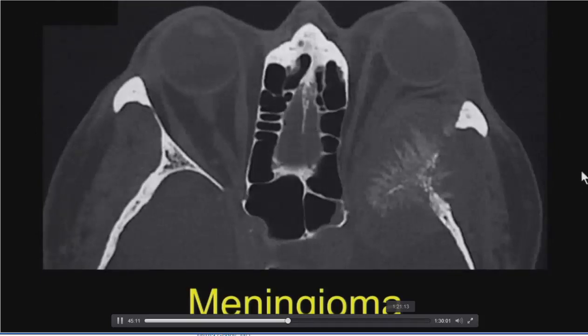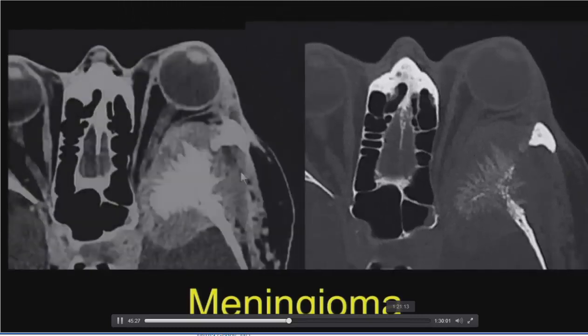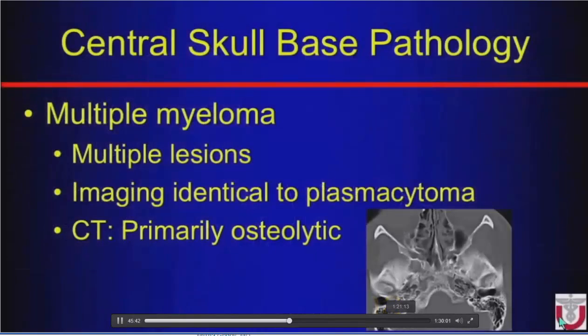They can also be intraosseous. Here we have a bone algorithm. We see this lateral wing of the sphenoid, and this more aggressive kind of periosteal change. So we're thinking a much more aggressive thing. Is this a telangiectatic osteosarcoma? This is something really bad. But we look at the soft tissues that are around it, and we see the soft tissues are very benign. And this is a great location for an intraosseous meningioma, that lateral sphenoid wing or lateral wall of the orbit. But we can have this sunburst appearance for the bones, so it can look very aggressive.